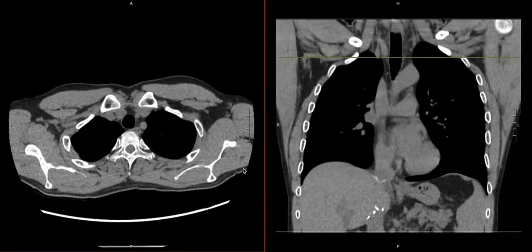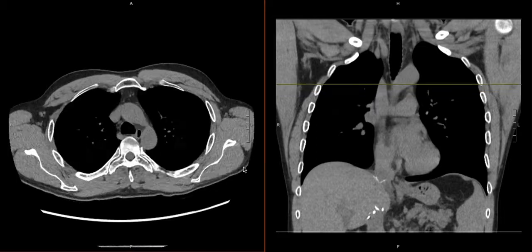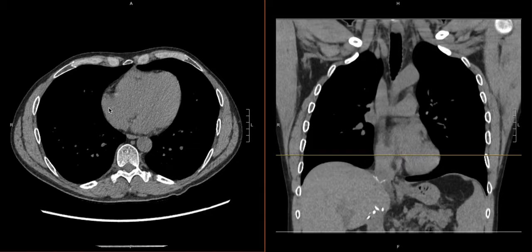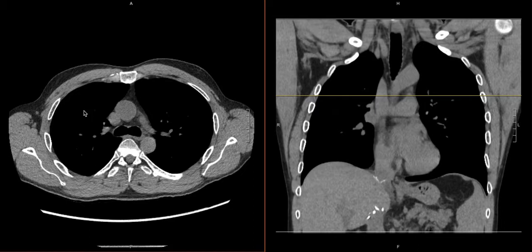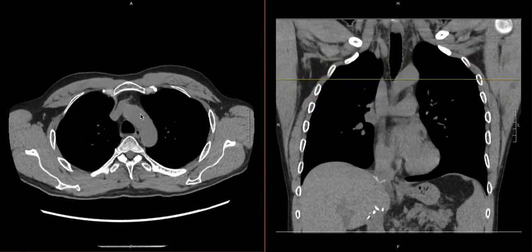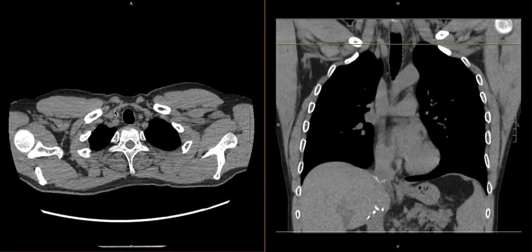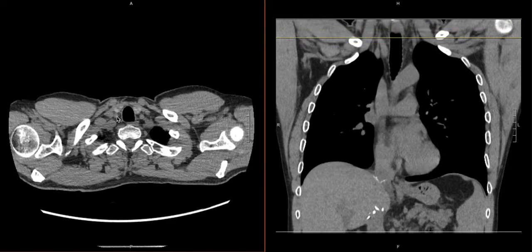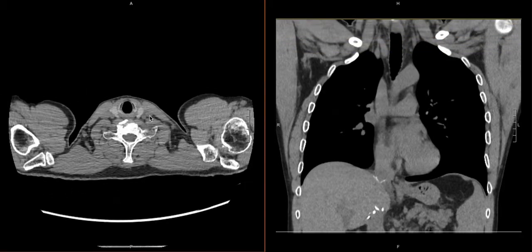So what you can do is maybe start near the right atrium here, and we'll just find the right atrium right here, and then we can find the SVC, which is right here. And you can trace some of the large venous vessels that plug into the SVC. And as you come up, you can see things like the jugular veins, which are right here. This is the carotid, this is the jugular. So you can actually follow, and then here's the left jugular.